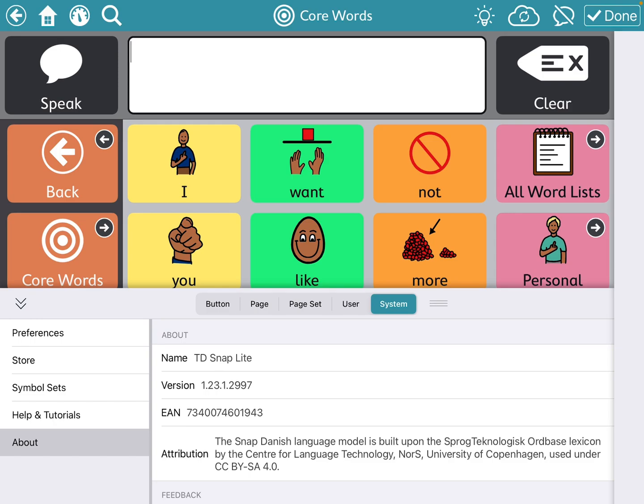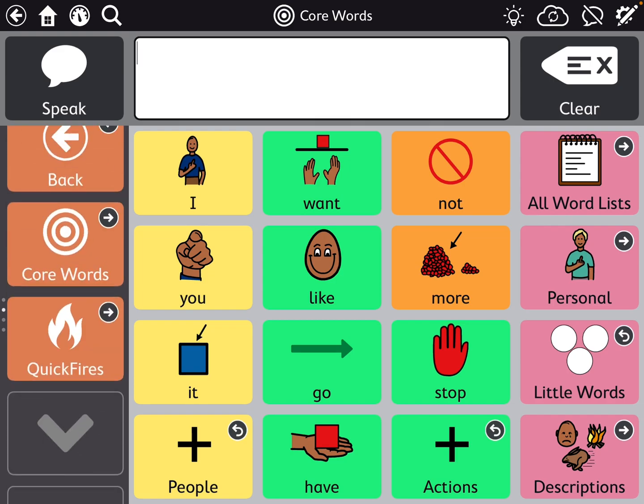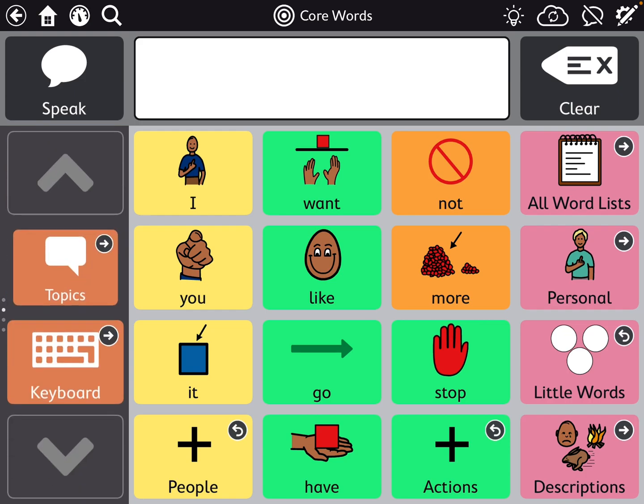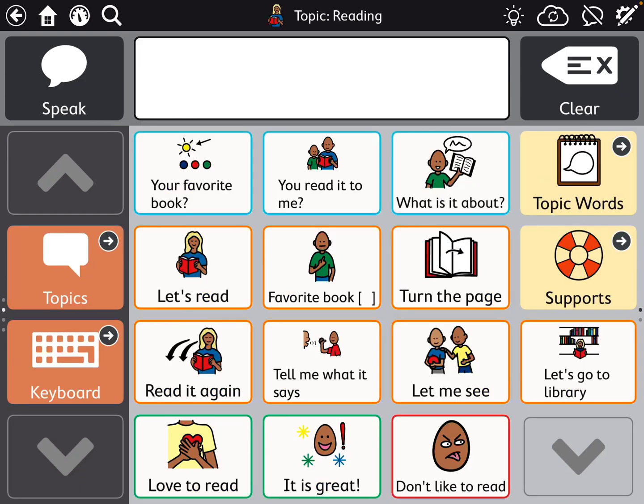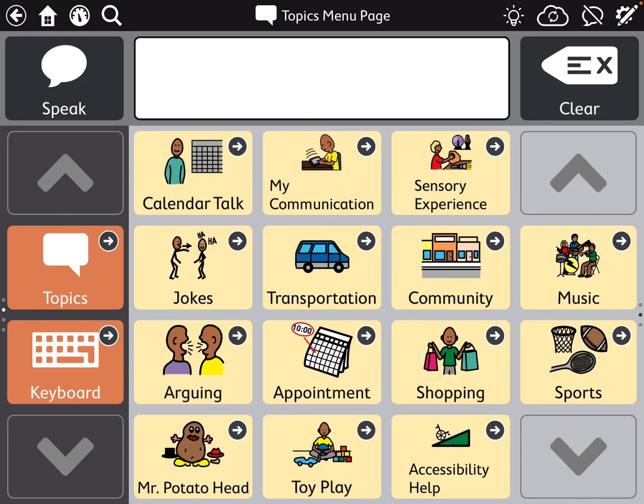So when we're done, we can just press the done check mark in the top. And as we can see, our navigation arrows have been added, so we can tap these instead of needing to swipe. So this would be useful for Colin. And this concludes our demonstration.